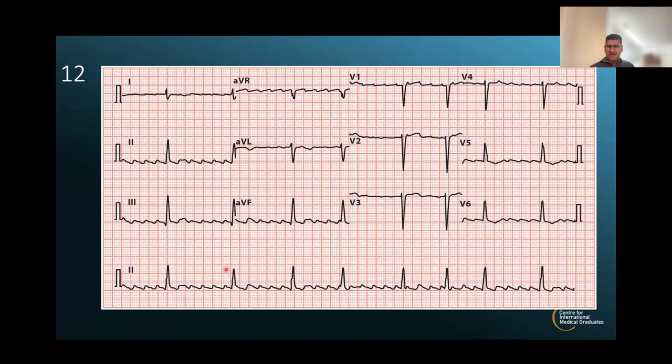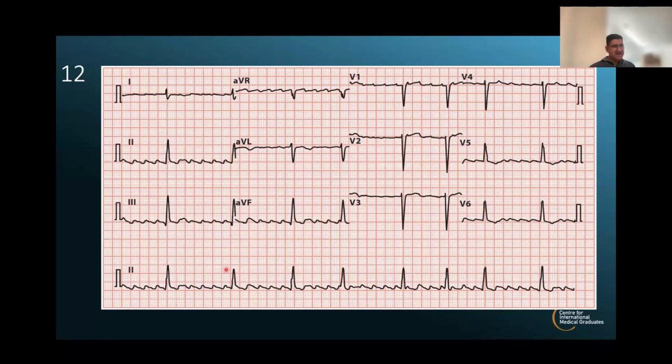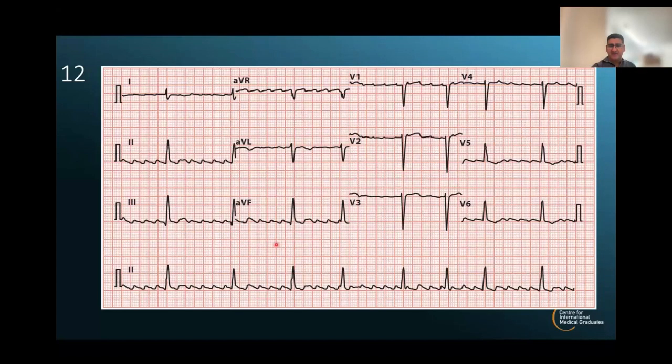I would question your 8 times table though. So it's about 48, isn't it? 6 times 8. Yeah. Take your word for it. No, don't take my word for it. Just look at it. But essentially it's bradycardic, isn't it? It looks slow. Yeah?